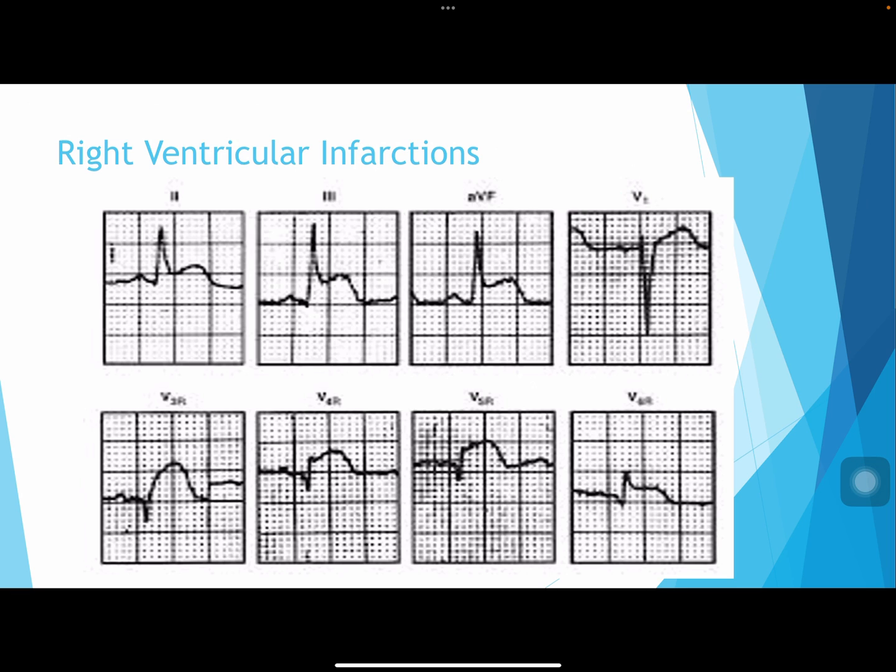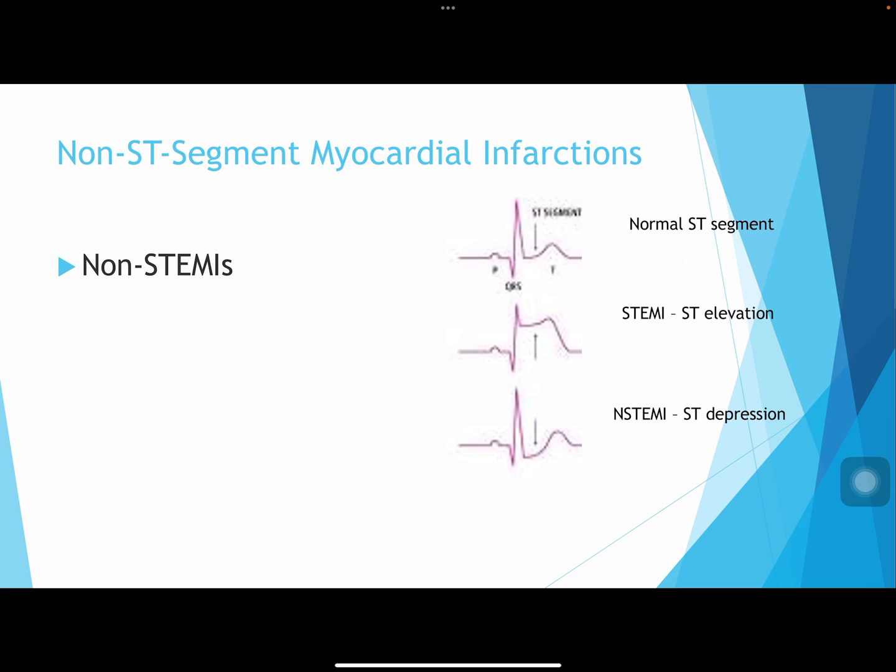Next slide, non-ST segment myocardial infarction. So we call these NSTEMIs or non-STEMIs. So if you look in the slide that I pointed out, I just said what is normal for an ST segment, what's ST segment elevation with the STEMI, and then obviously with your NSTEMIs or your non-STEMIs.